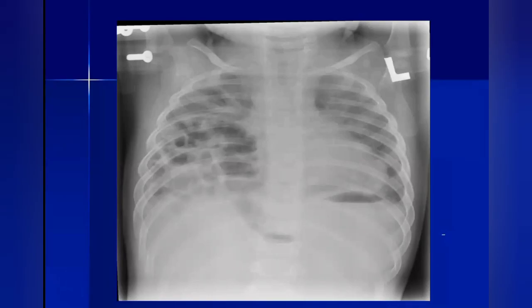its wall. Yes, sir. What else from CT? What else? Other things that are associated with diaphragmatic hernia? I can give you some DD of it, like CCAM and sequestration, which come in the DD of CDH. I asked you for the differential diagnosis of these cystic lung lesions, but we agree the multiple cystic lung lesions are communicating with the abdomen. Yes, sir. And we conclude it is diaphragmatic hernia.